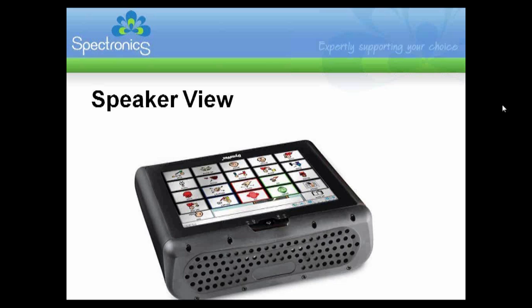There's also one underneath, and that infrared port, as I mentioned earlier, is for allowing you to program the device with anything that runs with an infrared remote. So often DVDs and CD players and TVs can be programmed, and the device can learn the controls so that you can control your environment with a different access option.